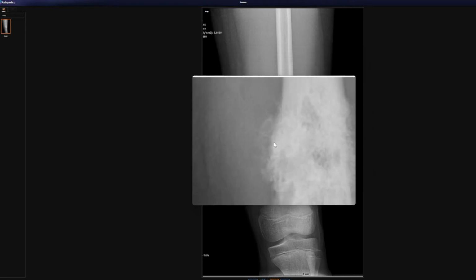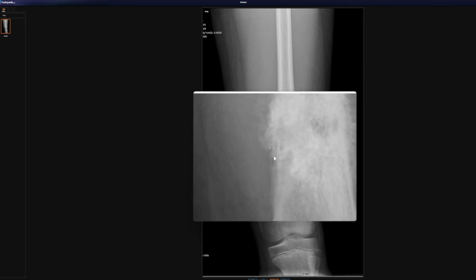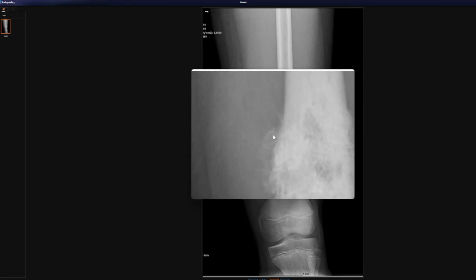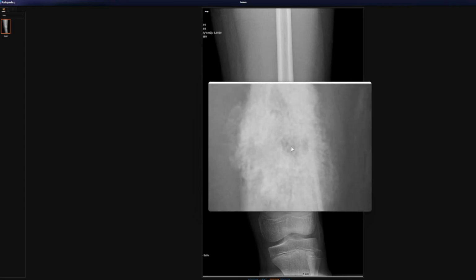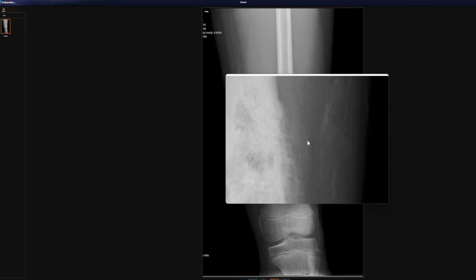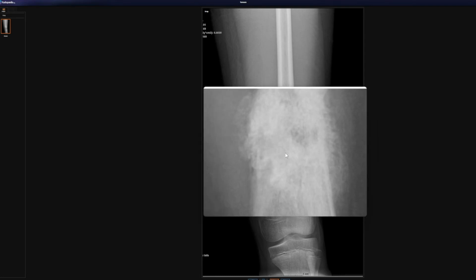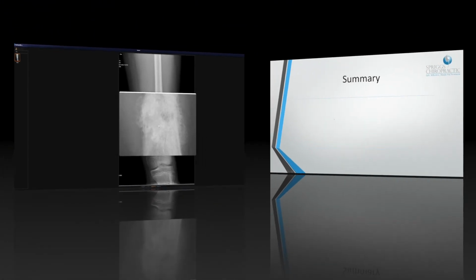We have that periosteal reaction present. Again, we've got a mixed appearance with laminated and that hair on end or sunburst periosteal reaction present. We've got a mixed appearance of the tumor itself with soft tissue invasion around it. So now we're describing a lesion that is much more likely to be a malignant tumor process. So this is a primary malignant tumor within an immature skeleton. So this is going to be much more likely to be an osteosarcoma.